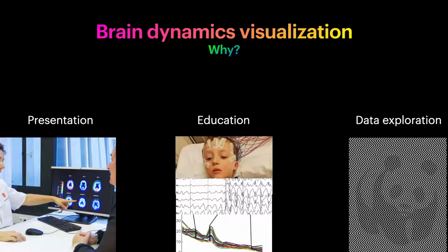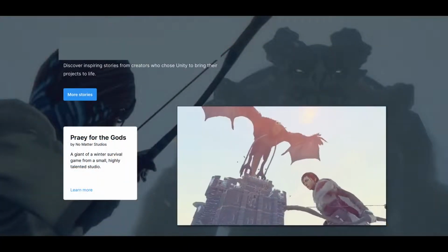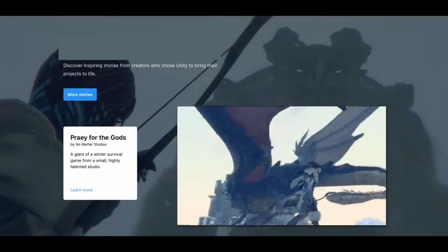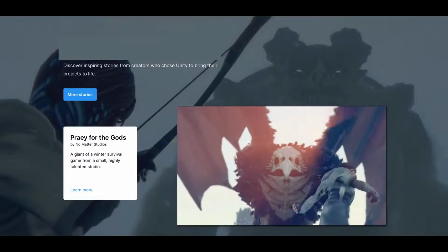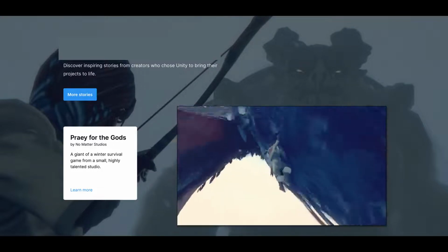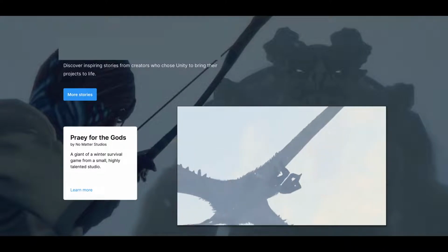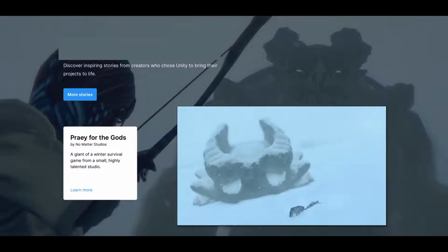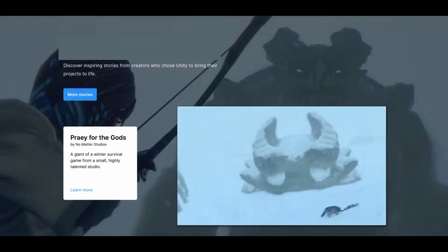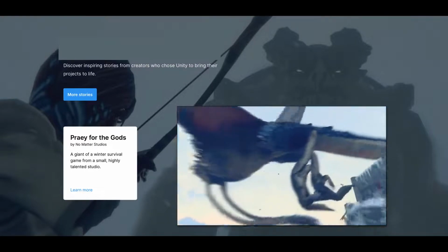How are we going to do this? Meet the game engine. My own computer game playing was mostly in the era when the main character was just a few pixels, but nowadays games are frighteningly realistic. Wouldn't it be great to be able to harness this kind of graphical power to visualize brain activity? Well, yeah, but programs like this are probably very expensive and complicated, and you need to have a team of dedicated programmers. Not at all. This top-level game engine is freely available on the internet, and you can start right away this afternoon.